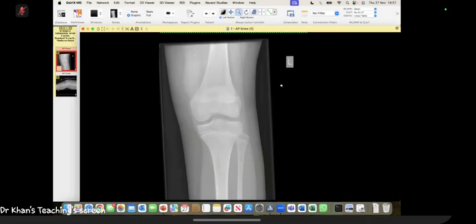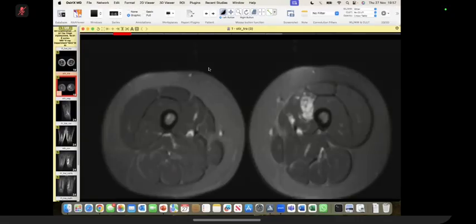So it could represent neurocysticercosis, which could be a possibility in this case considering the appearance. It could also be a hemangioma with phleboliths, which can give rise to this appearance. So I would like to proceed with the MRI images or any ultrasound images available for this patient for confirmation of my diagnosis.